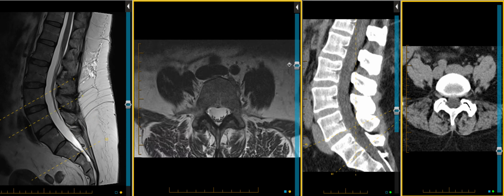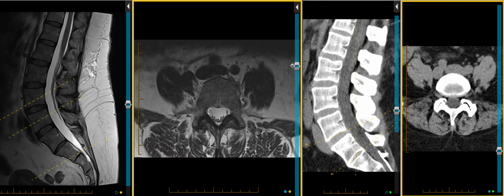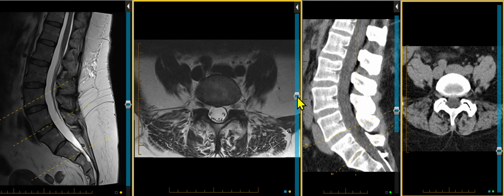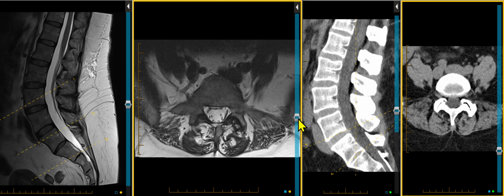And as I go higher into the more stable regions of the spine, you can see that it's a little bit better, but still not great. As I come down low, look at those wispy little fibers there. And those are the important ones, not really these general stabilizers out here. These are all the general stabilizers. They're nowhere near as important as the deep multifidus fibers, which are the intersegmental stabilizers.